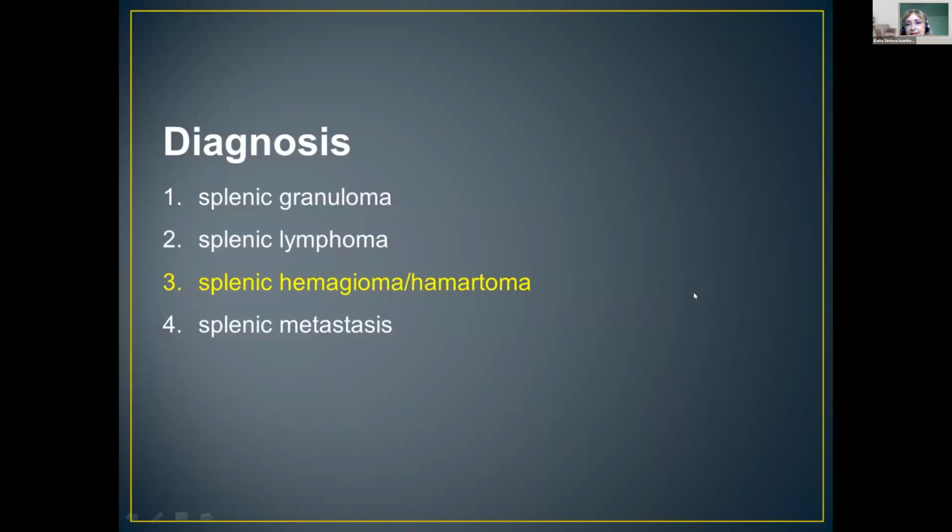I think it was very similar to liver hemangiomas. Yes, I think hemangioma. It looks similar. It's benign. That is important. Yes, that's certainly a benign lesion.